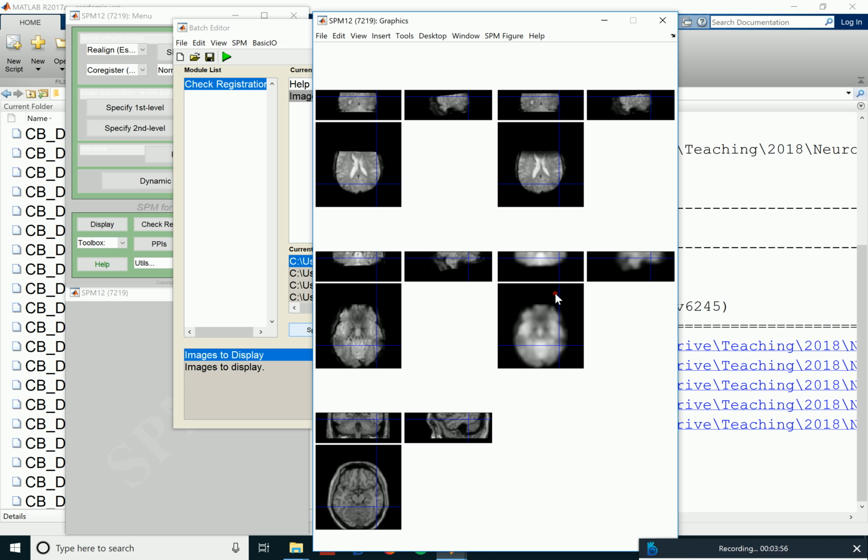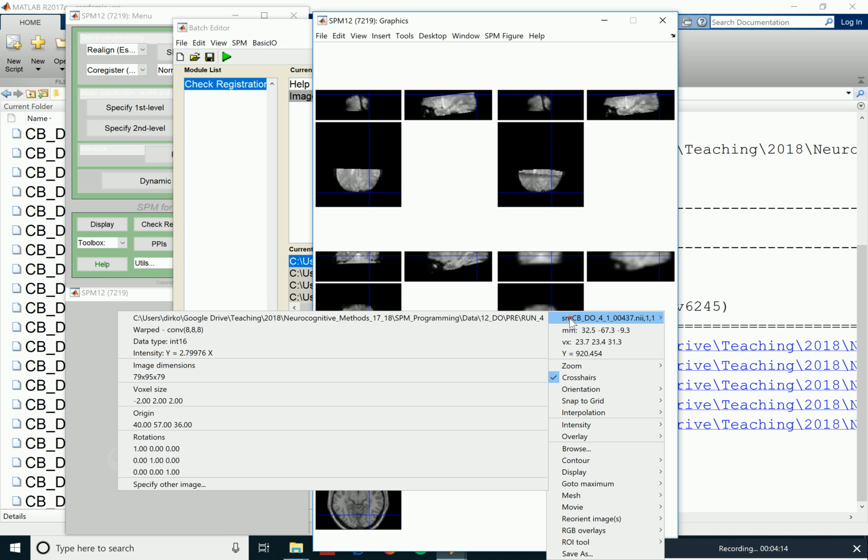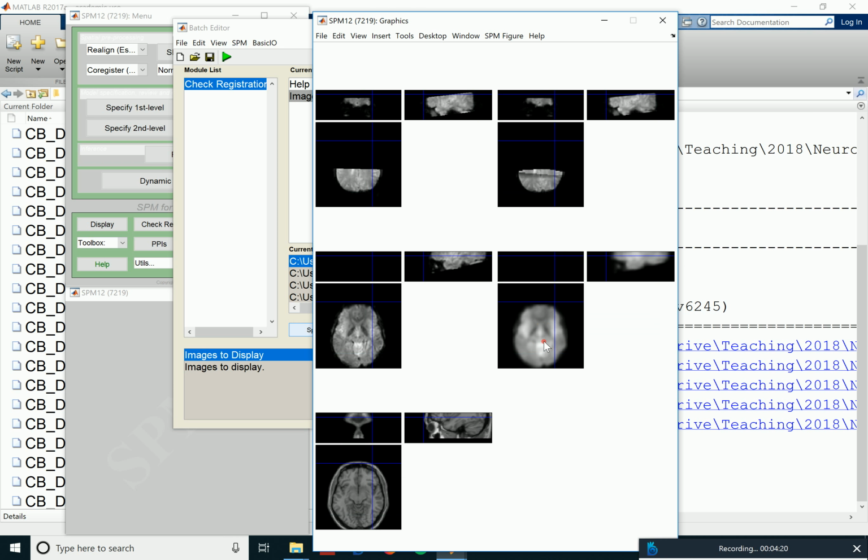The last thing that we haven't looked at yet is the smoothing. And as you can see, smoothing makes things more smooth, and it makes it quite smooth. So this is the effect of spatial smoothing. Yeah, these are the steps that we took. So this is now the final one, the smooth, normalized, and realigned one. And on these, we now will do the GLM.